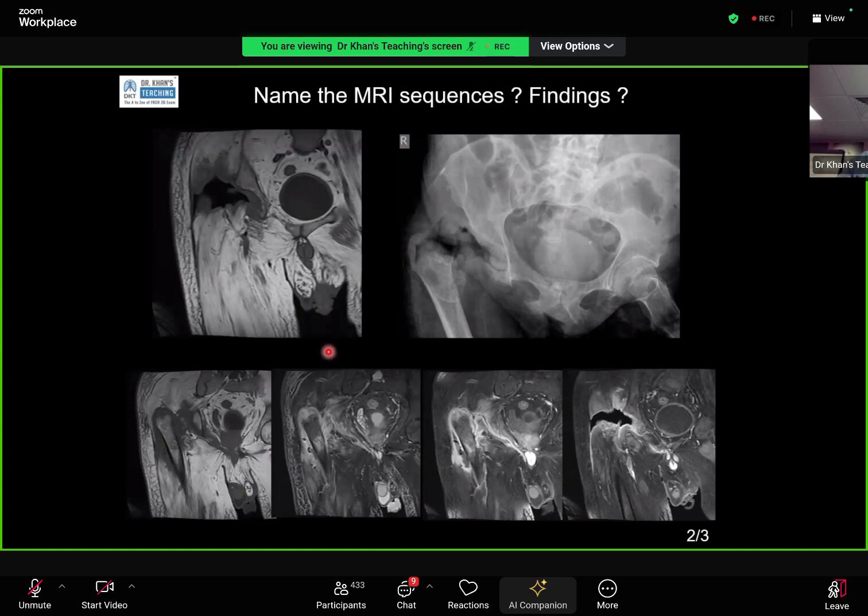Now, on this MRI scan, we can see this is a T1, this is a STIR, this is post contrast. And we can see the same findings. The air, of course, is low signal on this post contrast as well as pre. On post contrast, we can see this enhancing phlegmon. And here, of course, there is no fluid, there is air, which is surrounded by high signal or enhancement. But the key finding in this case was that there was air here and there should not have been any air here. Well done.